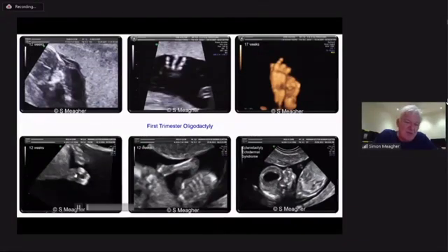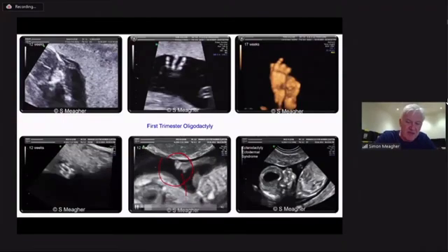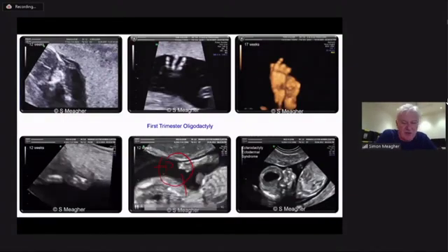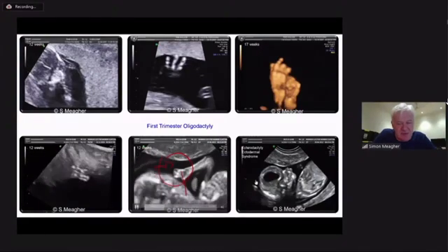And it may be more severe. This is a fetus here with a thumb and just 2 digits coming across, so a more severe form of oligodactyly. And here is what's more concerning, because here I can see the thumb, but I can't work out whether there are discrete digits or not, because there's syndactyly. And as soon as I see that, I become more suspicious.